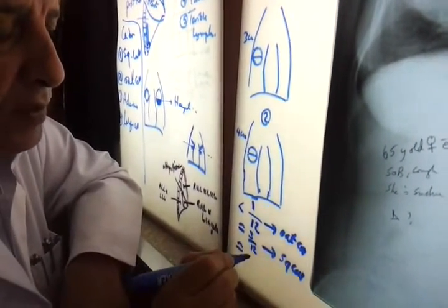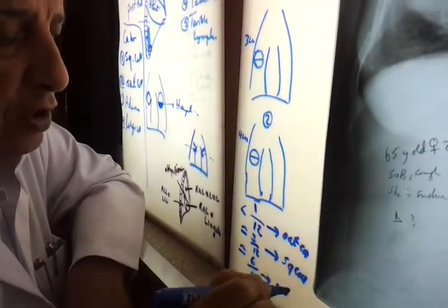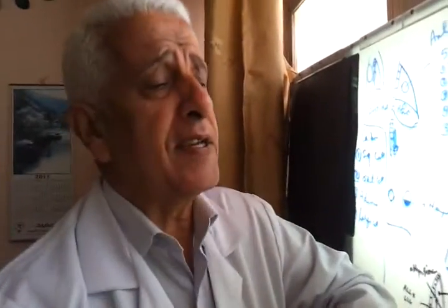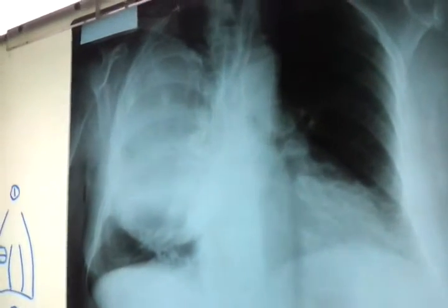If it is around 6 months, this is what? Adenocarcinoma. Therefore, most probably this is a squamous cell carcinoma in this lady.